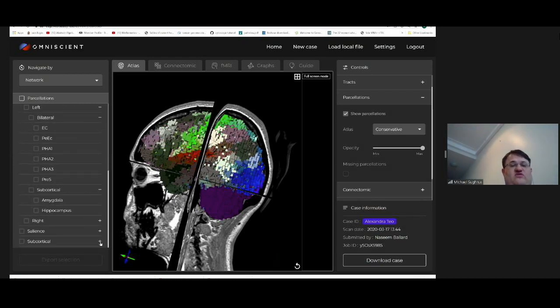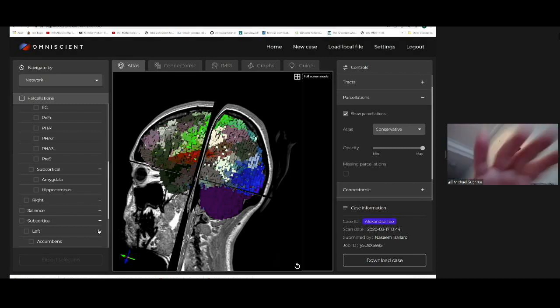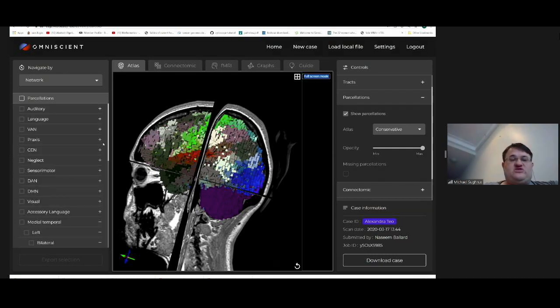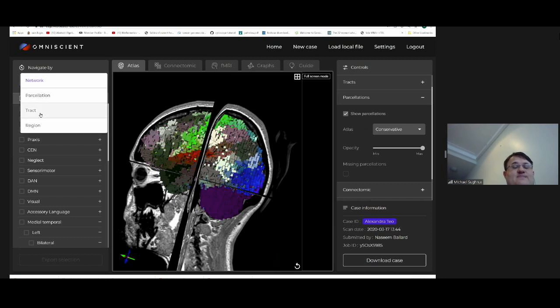In the subcortical area, we map the big structures. We're working on making a more detailed subcortical atlas. Again, we were very impressed how well it did with finding basal ganglia in general. So we didn't go for the win, but we think that given our understanding of this atlas, we can get probably very compelling subcortical resolution, just because we have more experience with this now. And again, we have different combinations.